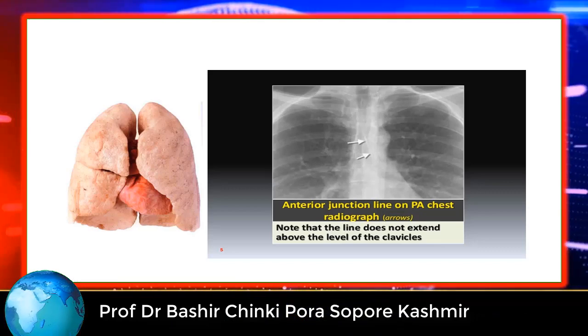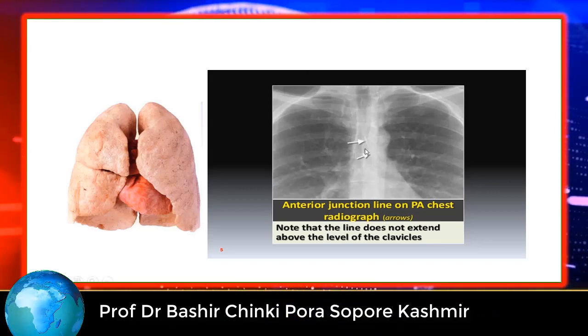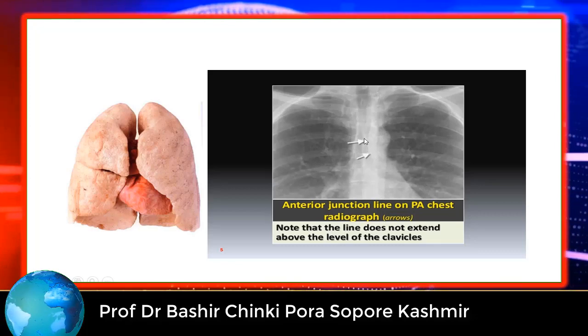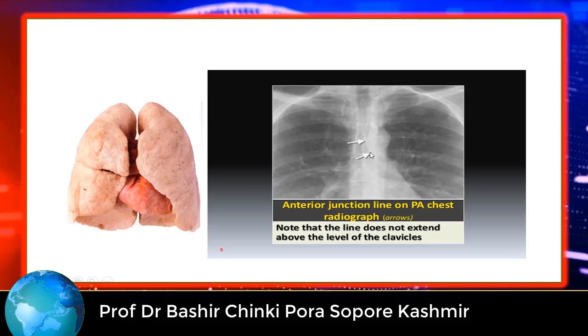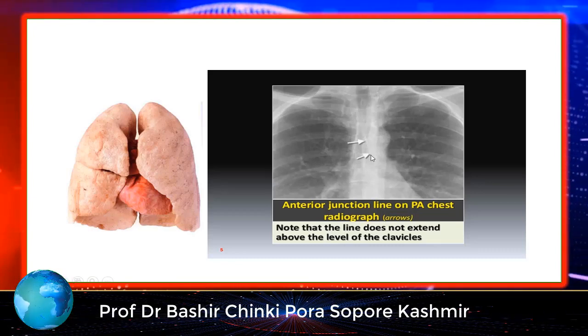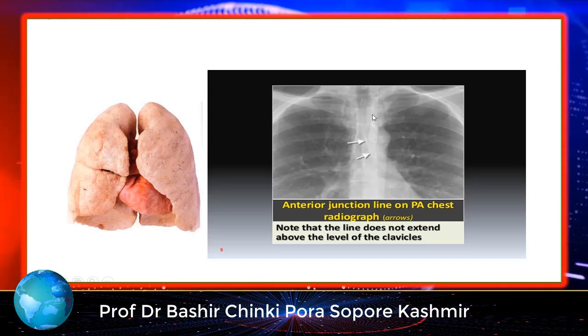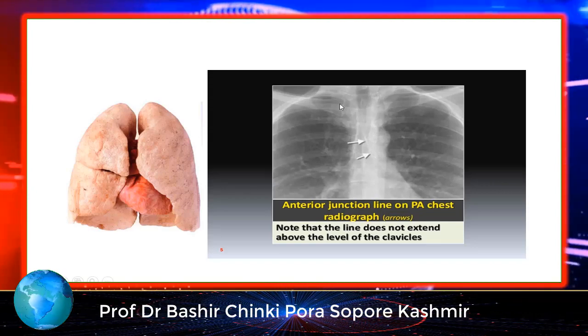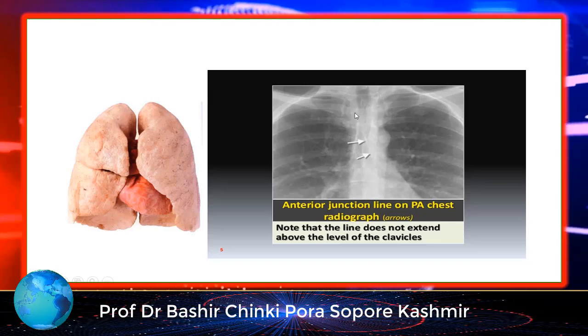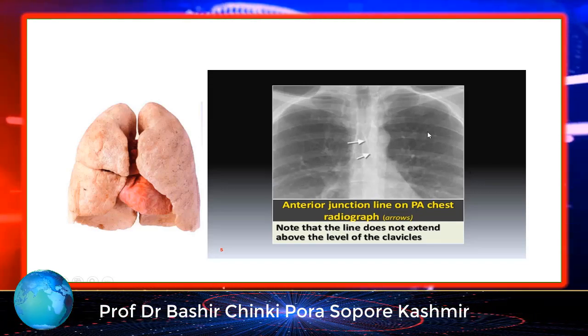You can clearly see that this anterior junctional line does not extend above the clavicles, or above the manubrium sterni.